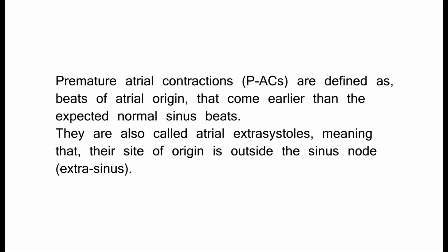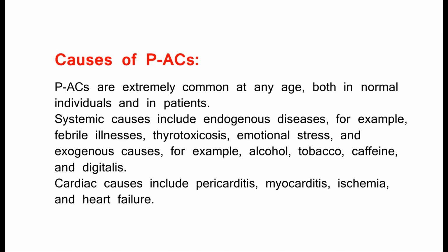Premature atrial contractions. Premature atrial contractions, PACs, are defined as beats of atrial origin that come earlier than the expected normal sinus beats. They are also called atrial extrasystoles, meaning that their site of origin is outside the sinus node, extrasinus.